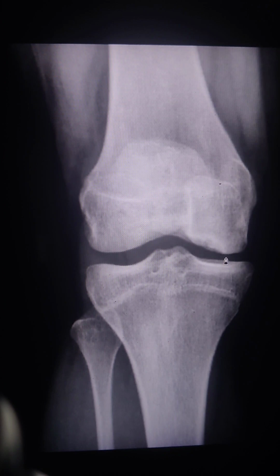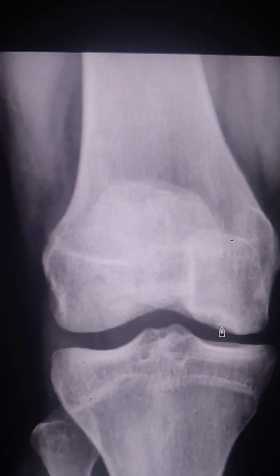So first of all, X-ray. X-ray is really non-specific for this condition, and sometimes it may be unremarkable and sometimes it can show you a subchondral defect, like we see in this case. So this is the femur, this is the lateral condyle, this is the medial condyle. Here we have the proximal part of the tibia, this is the lateral tibial plateau, medial tibial plateau, and here we have the fibula. So on the lateral aspect of the medial femoral condyle, we see there is this subarticular defect.